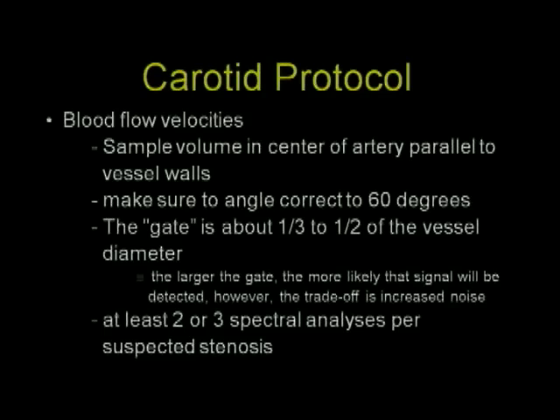The gate in a normal vessel should be open to about 1/3 to 1/2 of the vessel diameter. Keep in mind that the larger the gate, the more likely you will be to pick up a signal. However, the trade-off is increased noise and the potential for spectral broadening.